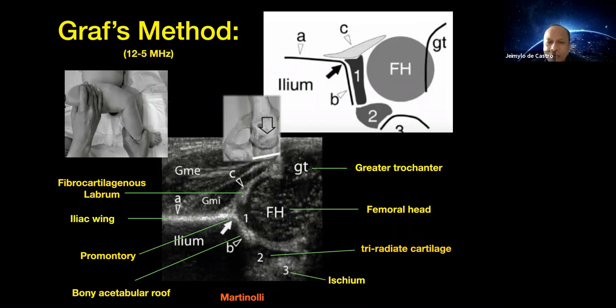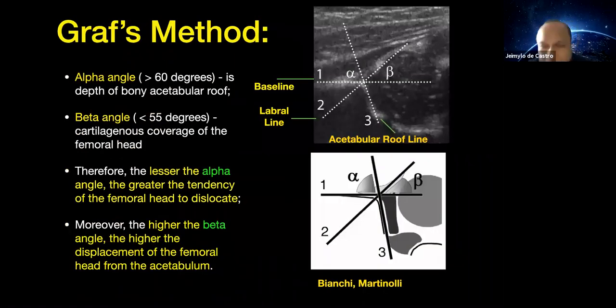So if you try to picture that, that is exactly how you see a typical hip dysplasia ultrasound scan. So it should always appear like that. Okay, then from this drawing, we now draw the angles. You can identify two angles here: the alpha angle and the beta angle.